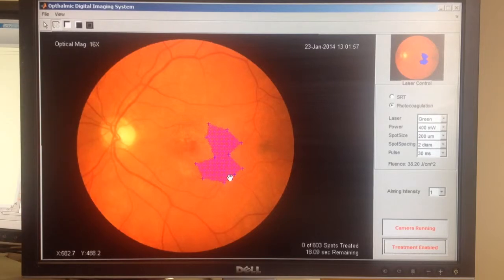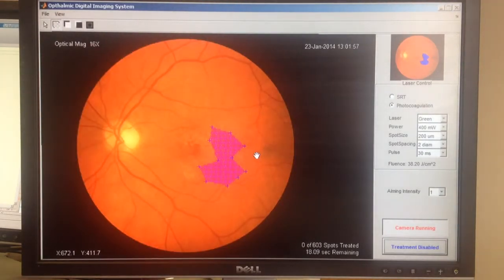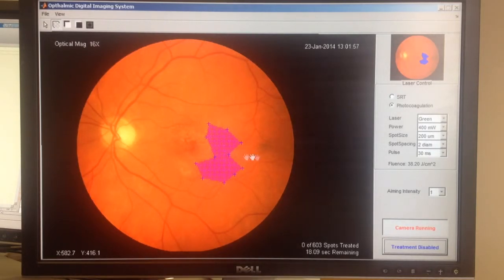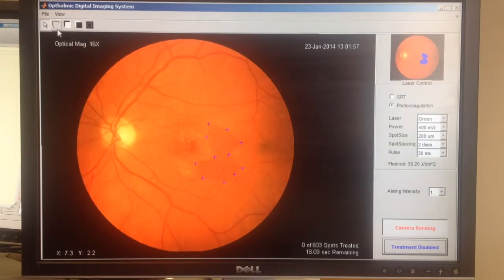So for photocoagulation, this puts us one step farther down the road in that we can have any shape pattern instead of the patterns we currently have with the scanner. Yeah, the shapes can be custom shapes. And I guess the next step, Pazit, would be to take this software and interface it over the USB bus to the scanner again, so that the aiming beam would follow and highlight this pattern on the actual patient. So I think that covers most of it.